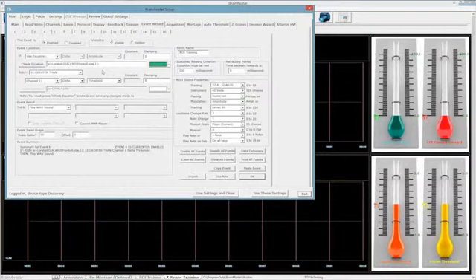Now, we've added some really new features to this. And I want to say that use this with caution. These are very powerful tools that I'm going to give you right here. And it's probably best for analyzation versus actual training. But if you want to use it, it is, of course, the clinician's responsibility to use a feature to the best of its ability, and it functions as intended.